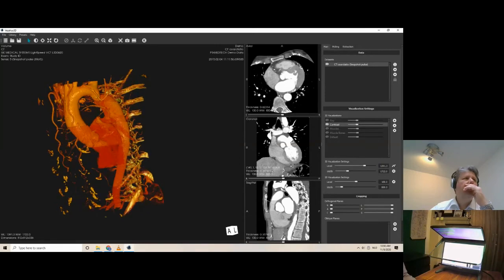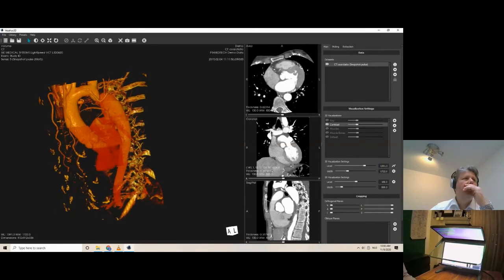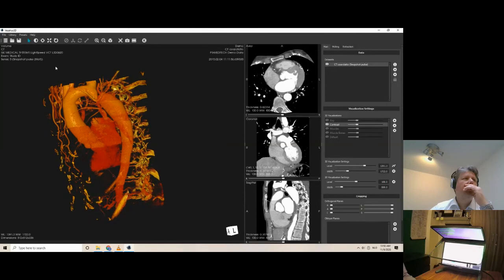But I'm working on a laptop, gentlemen, and everybody in the audience, ladies and gentlemen. Here, Mark already pointed it out, is a problem area, right? So I can smooth it up a little bit more. Let's say I am interested in this area and I want to have it printed. Again, I'm not the expert, but I want to get this printed.